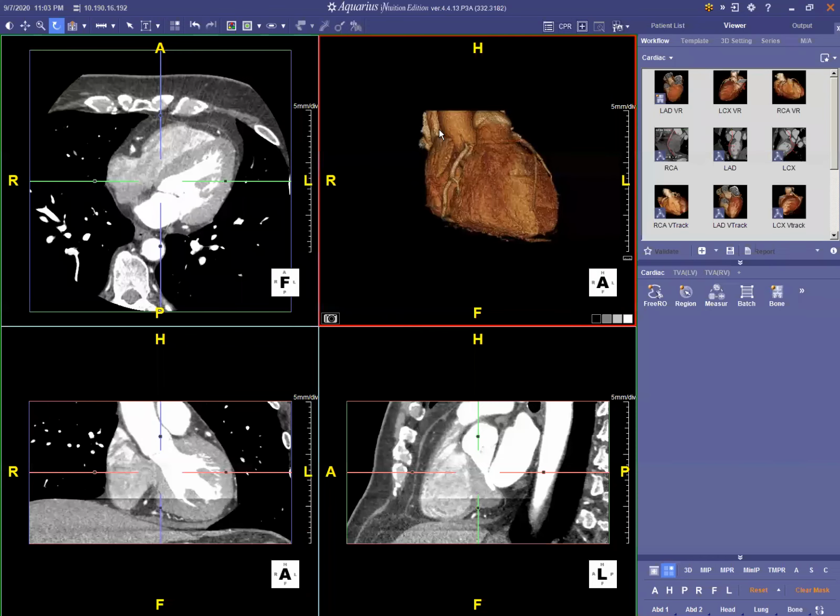In this second video tutorial, we're going to go over some basic measurement tools and labels. So for measurements, there's a basic distance tool here in the upper left portion of the screen. You can activate it by left clicking here where it says distance, where the icon is a ruler, or you can hit D as a shortcut.